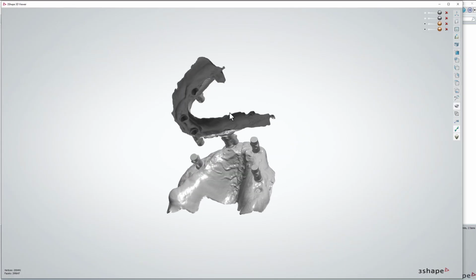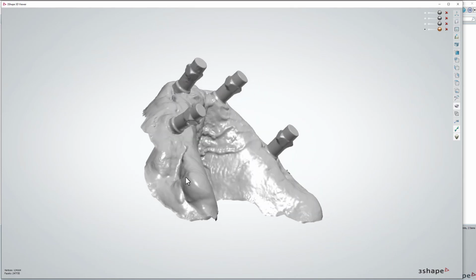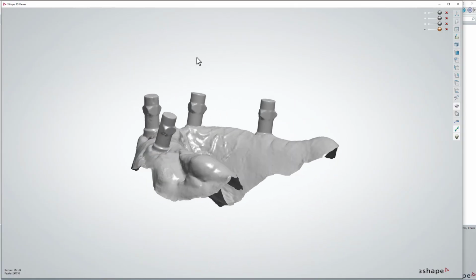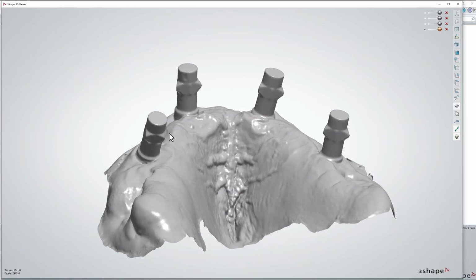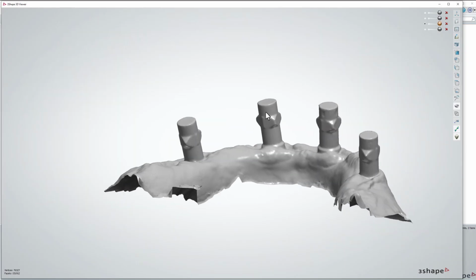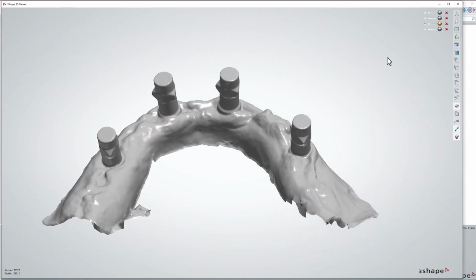So these are our scan body scans. And again, you can see we have palatal data that matches what I have on the bite in the conversion scan. The scan bodies are relatively good. They're a little fuzzy here, but more than adequate for what we needed. And then we did the lower. And she's like, what about the bite? I said, don't worry about the bite. Just get out and give me the files. So that was the case here.